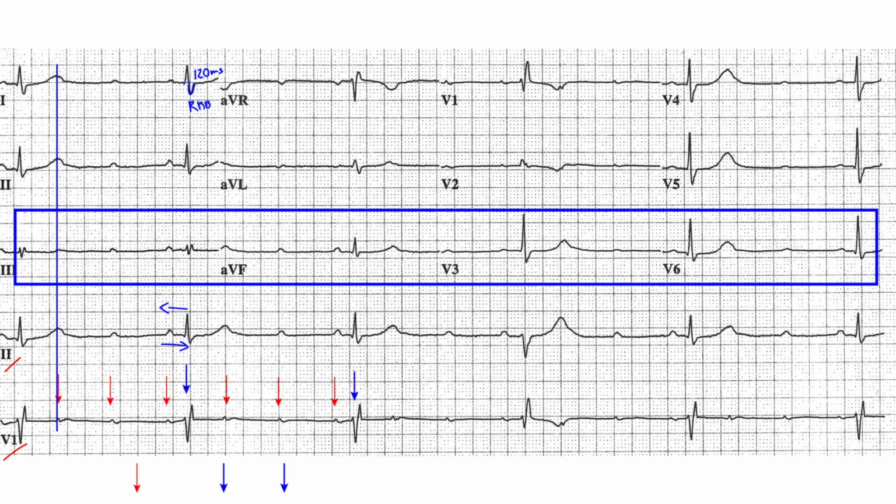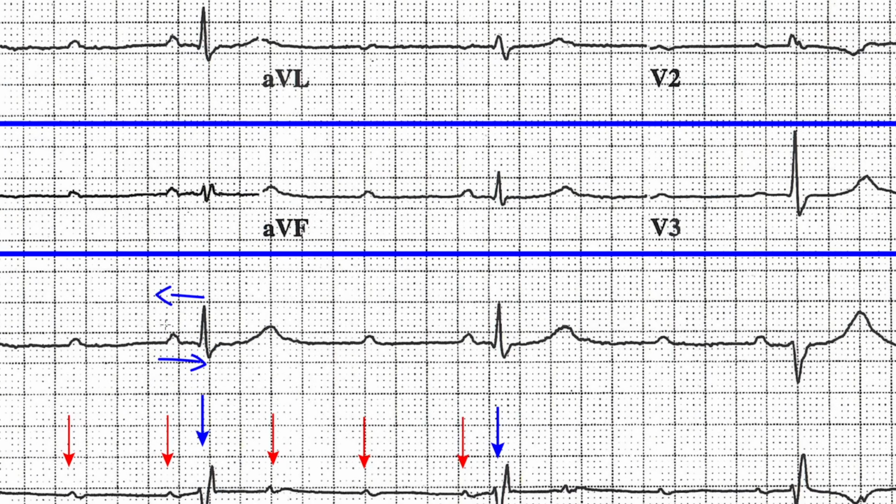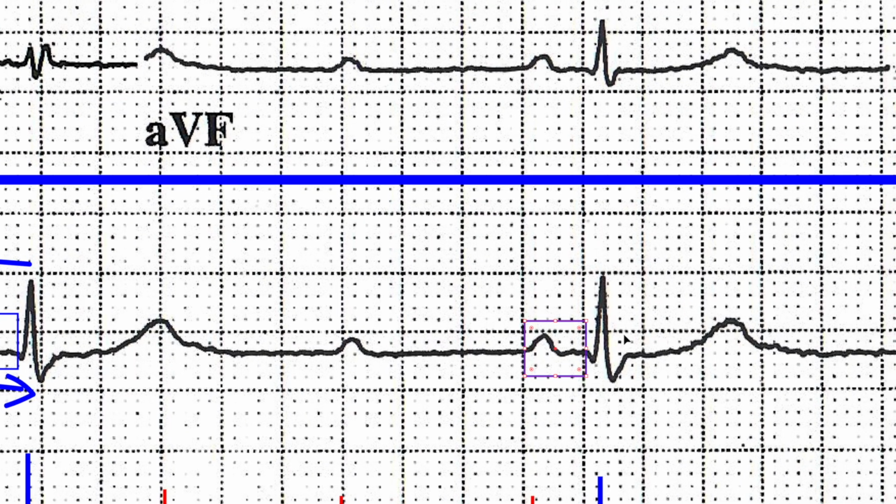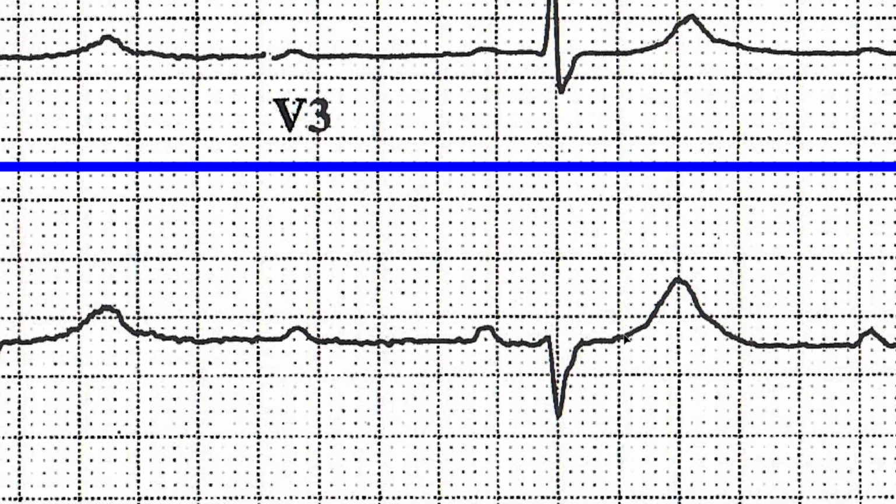So right now, what I'm going to do is I want to take a look at the PR interval. So this is my PR interval on this beat. So I just copied it, the box is identical. This is my PR interval on this beat, and that's the same. Here's the same box. I'm going to drop it down here.